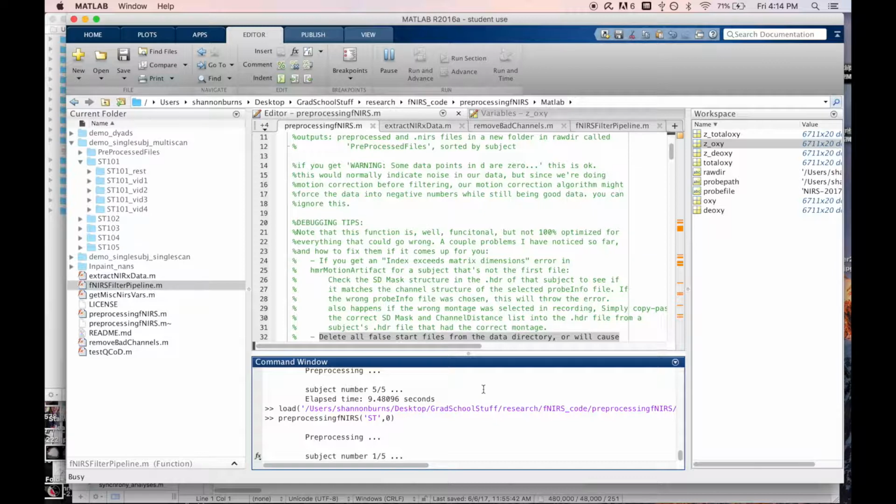That's because in this study we had 108 channels instead of 20, and then there are 5 scans instead of 1 scan per person. So this will run slower, but I've still never had the problem where this would run or take longer than some MRI pre-processing pipeline. When I did this study in a batch of 60 subjects, it took me about 20-30 minutes. And so when this finishes running, we can see exactly how long it took. It'll probably be about a minute in this run.